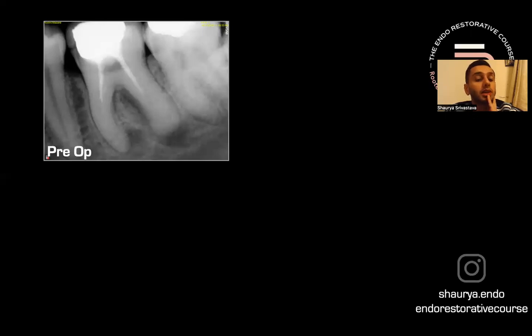Endo was done about 15 years ago. So when we look at the radiograph, there's an amalgam restoration here. There is some sort of a fracture of the mesial cusp or mesial aspect over here. Amalgams are known for hygroscopic expansion, and therefore also notorious for finding cracks underneath them upon removal. So there's a fracture associated over here.